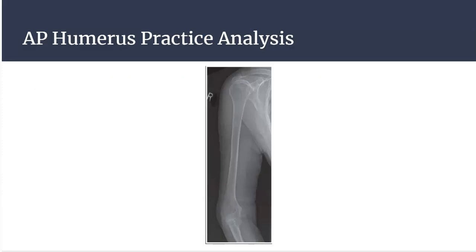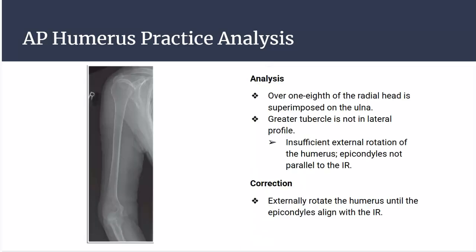Go ahead and review this practice analysis of the humerus and answer the following question. Let's review this practice analysis together.